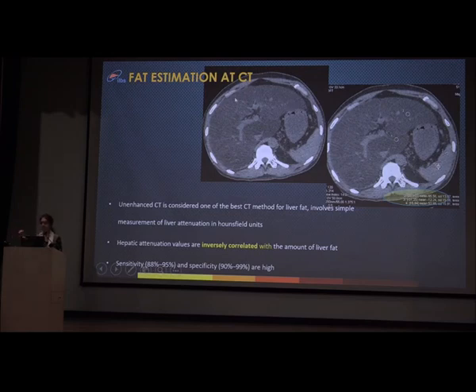You, second row, second one. Is this a plain CT or a contrast CT? Very good. But why do the vessels look bright? Yeah, you need to use the mics. So the liver is dark here, very good. So what he's saying is true. When you have fatty liver, that's what happens. The attenuation of the liver tissue reduces because of the increased adipocytes within the hepatocytes. And that's when the unopacified vessels start looking bright.